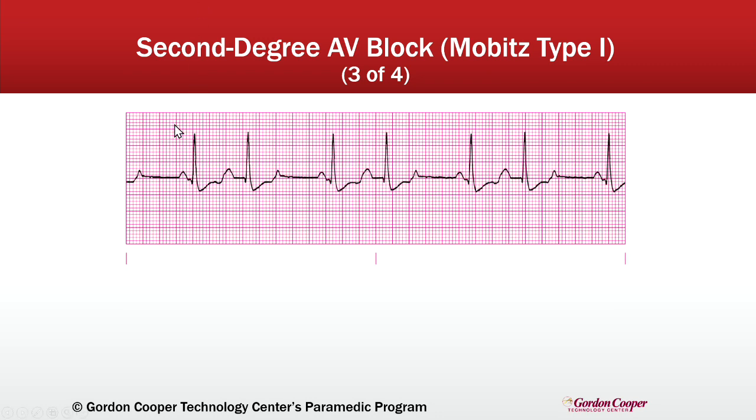Same kind of thing. So start here. And remember, you'll hear it said like going, going, drop, going, going, gone, or longer, longer, drop. That's not always the case. It's not necessarily just 2 beats and then a dropped beat. It can be 3 or 4. That's just something that gets said. But in this particular scenario, we have going, going, gone. So you see how it just marches itself out. So really it's irregularly regular, or regular, regular, irregular, because it has that pattern.